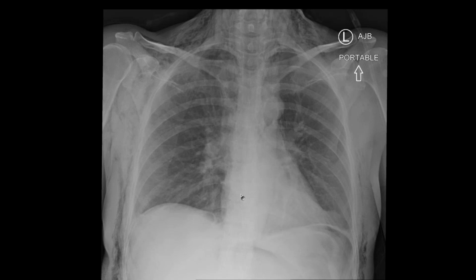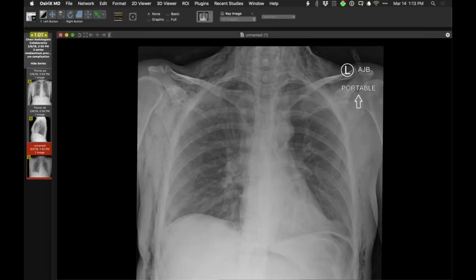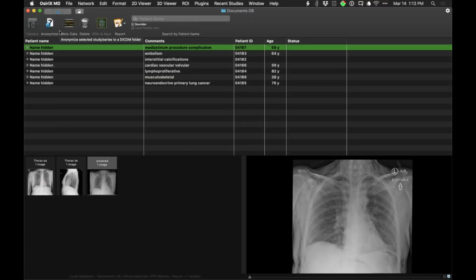But it's carbon dioxide. It's going to reabsorb very quickly. It's going to go away. And by itself, it's not going to cause any harm. And nothing happened to this person. So just a nice observation and putting it together with context.